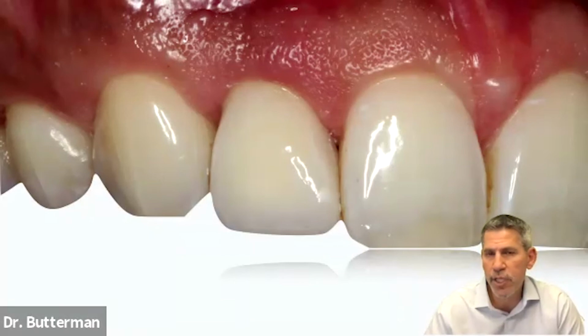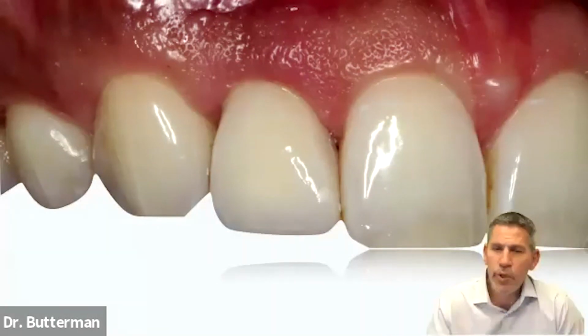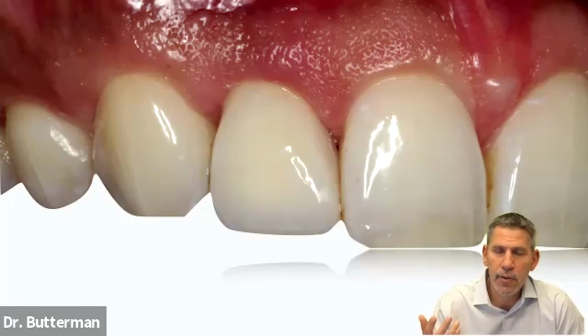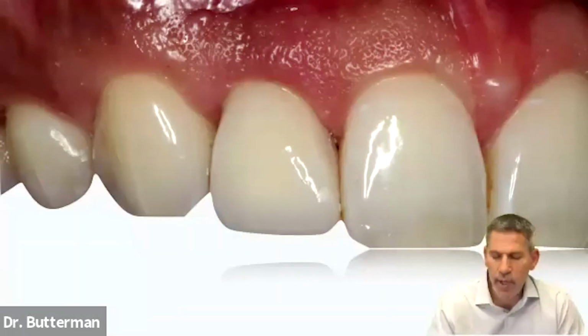We plan everything prosthetically, if we plan everything surgically, and there's no excuse nowadays. With the technology that I've talked about, simply using an Axeos scan and doing a Prime scan for optical scan, you know where it's going to end up. There is no mystery here. There are no surprises because of this. So there's really no excuse that I was trying to figure out, and we had to make compromises.